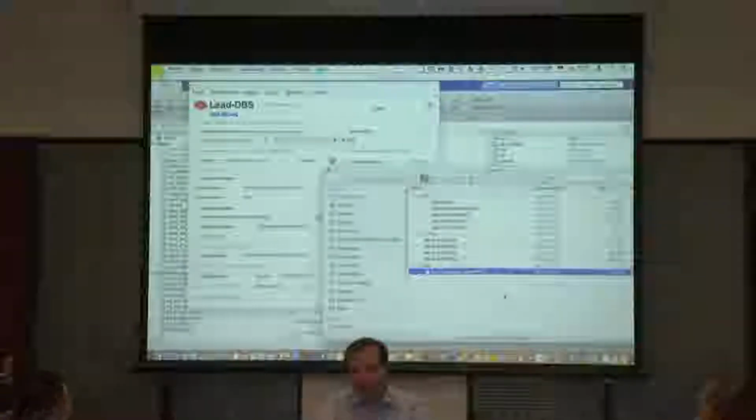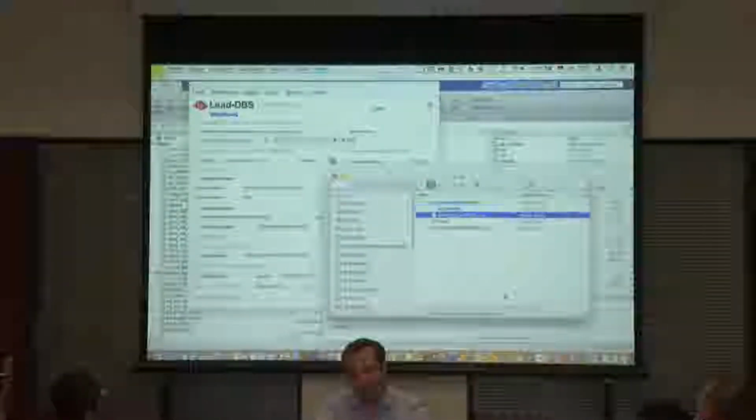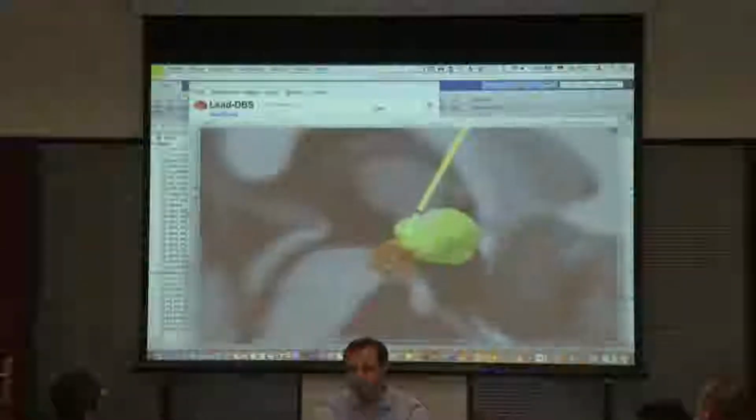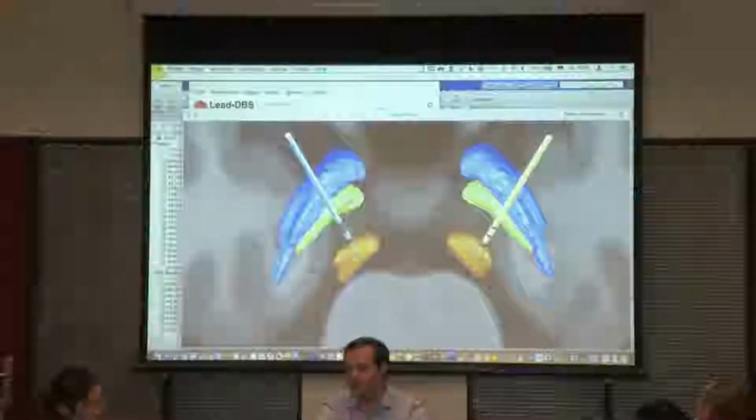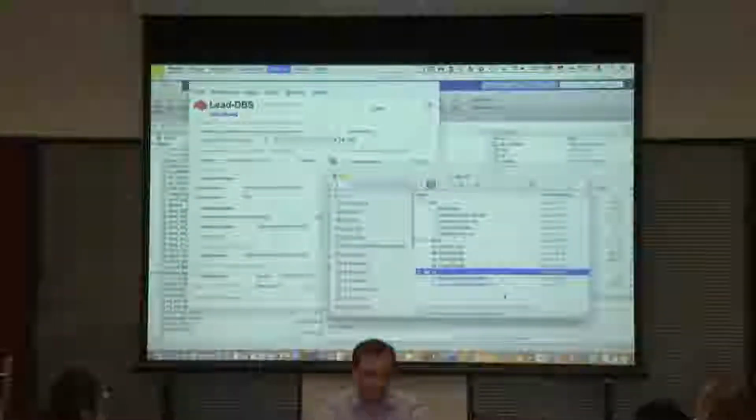Now it created a zip file, and inside of that we would have the combined electrodes and these views, where we have good orientation of what is what. Okay.